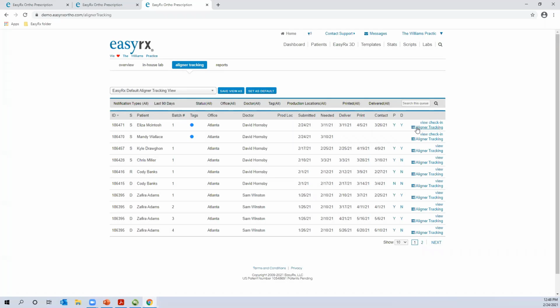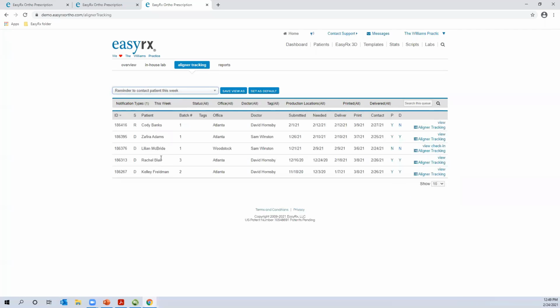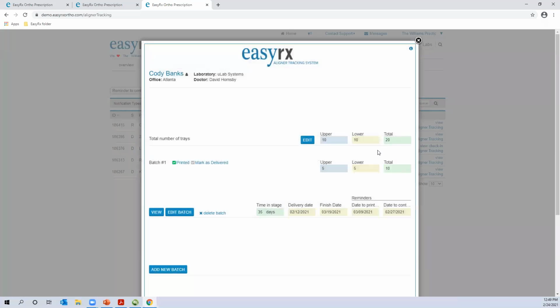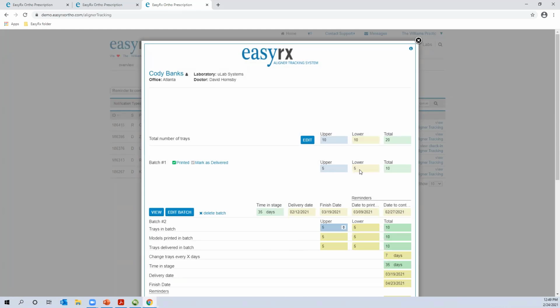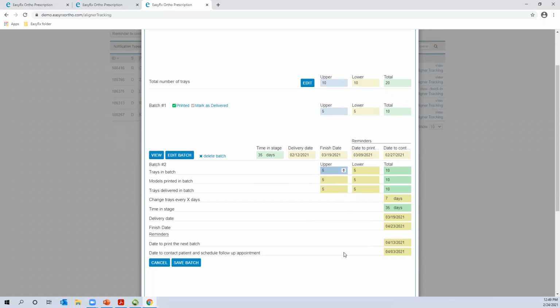So in a month or so, when you come in and you go to remind to contact patient, for example, this week, I have several patients that I need to reach out to. So here's Cody Banks. I know that I need to reach out to him. We can go into our aligner tracking dashboard. And at this point, this is when you create a new batch. So you're basically drilling down from what we've already done. So we've had 10 when we started. We've already delivered 5. The patient is tracking well. So let's go ahead and print our next batch of 5.